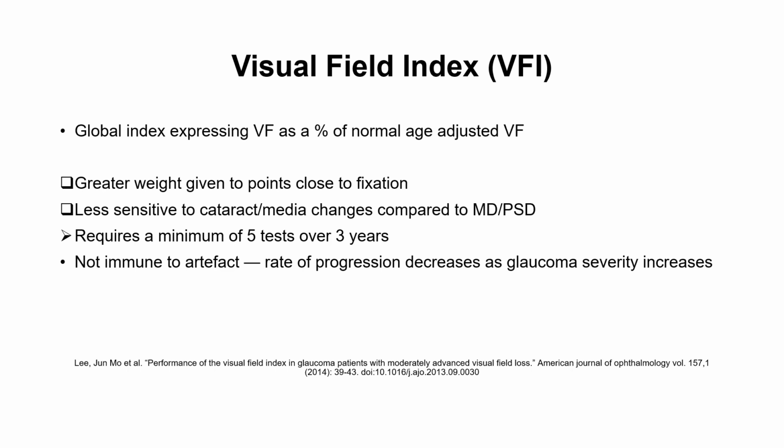Some artifacts can happen, like fatigue of the patient and other causes of artifacts in visual fields. Also, the rate of progression, as we know, decreases as glaucoma severity increases, because it looks like it has reached the maximal reduction, so it will not appear on the visual field index as a rate of progression. So it's a very useful marker to follow the progression of glaucoma patients in every stage. However, in severe advanced cases, you cannot depend only on the visual field index as a marker of progression. But in general, it's a very useful marker of progression.